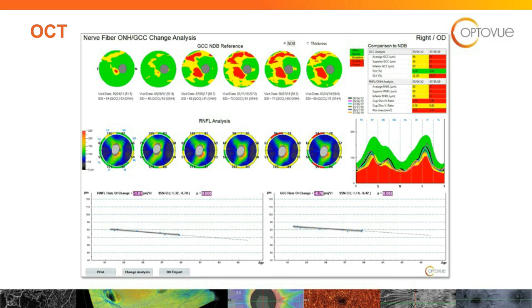That's being confirmed now in our nerve fiber layer scan trend analysis, bottom left-hand side. It's also being flagged in purple as reduced, losing 1 micron per year. And then in the ganglion cell complex, that's being flagged as losing 0.78 microns per year. And our confidence intervals are great, super thin in those particular areas.